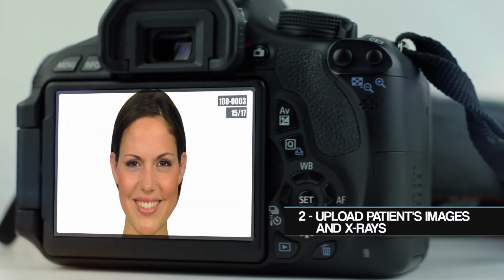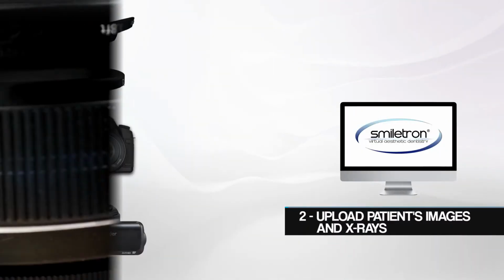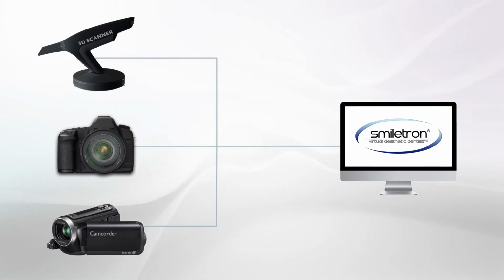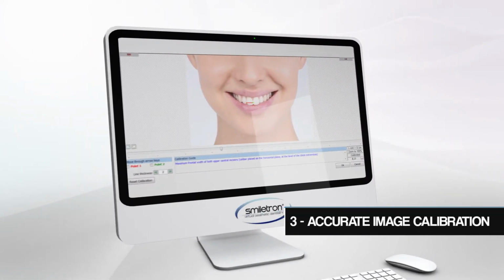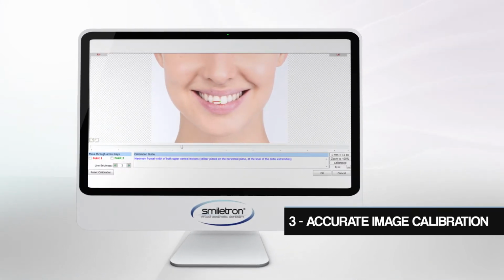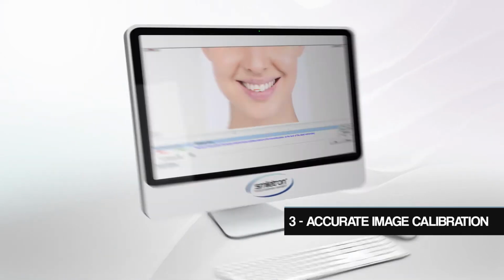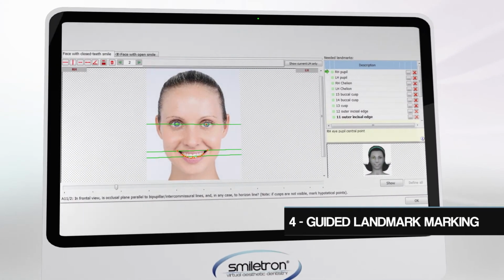The next step is uploading photos, X-rays, videos, 3D files, etc. onto the software and in the patient's file. The photos are scaled to real-life size through calibration with a simple software wizard. The fourth step is marking the landmarks indicated by the software with the wizard.